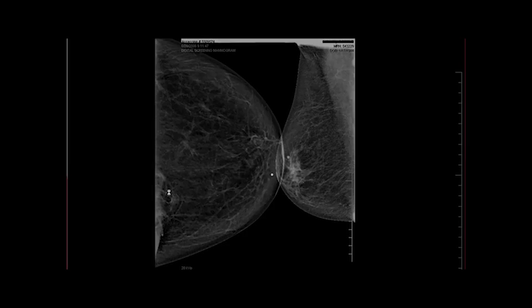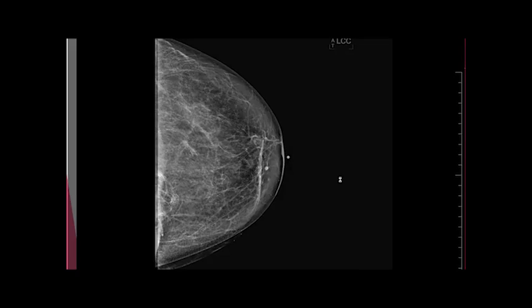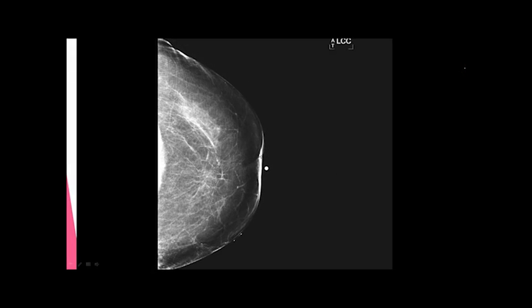Hair. Look at it here. There's hair. It's very subtle, kind of starts looking like vessels, but that's hair. The nipple's beautifully centered, though. I like that. This is a beautiful image. A little bit of skin fold, good muscle, nipples perfectly centered. But what do you see? Hair. See how subtle it is? Very subtle.